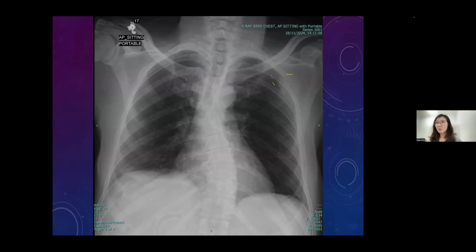Okay, so the third one is the third rib. You can still draw it very nicely. Kok Rui, well done. So 1, 2, 3, 4 ribs here following. Then 1, 2, 3, 4, 5, the fifth ribs are also quite okay. See the outlines can be seen. So yes, there's the eroded second rib with a soft tissue mass here. It is a destructive bone mass. On Facebook also, Ong CM and Arif Mukhtar said the one below the left clavicle and then the second lytic lesion. Yes, correct. Not bad, guys.